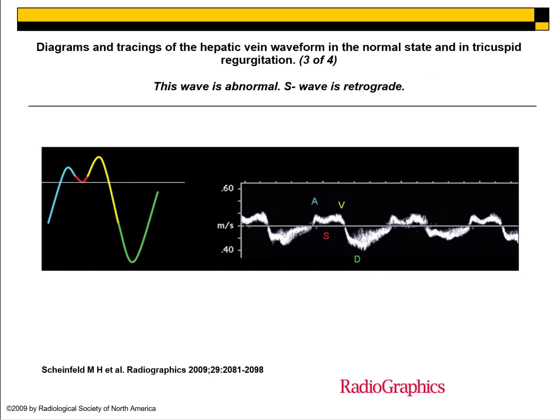So here's that ASV complex I previously described that we would see in tricuspid valve regurgitation as it gets more severe. And that makes sense now that we have this visual, right? The ASV just all flows together, and this little chart shows you once it hits right here, we don't really see any flow in that one phase in ventricular systole. So we don't have any systolic flow there in this waveform.